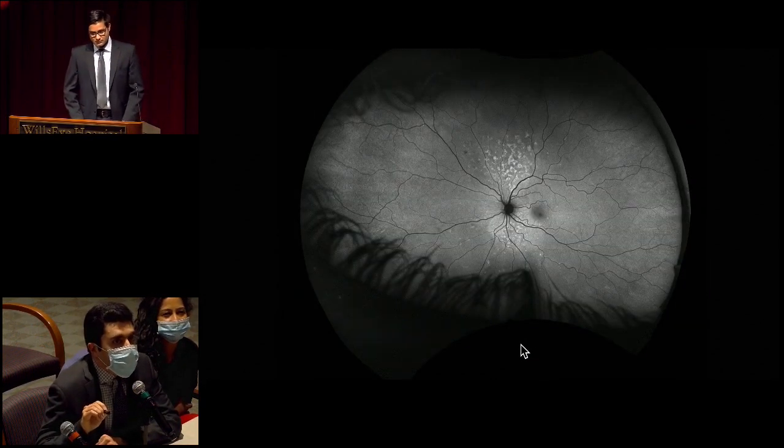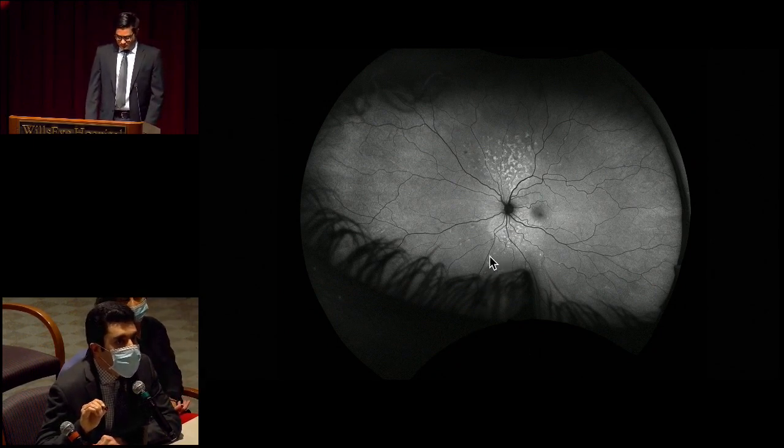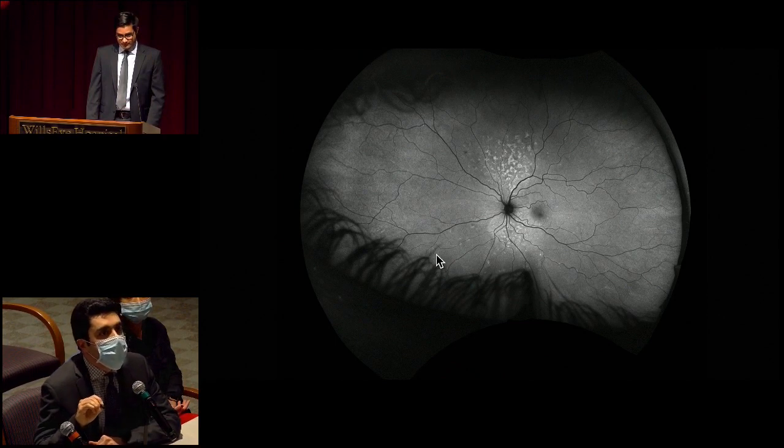Same imaging modality of the left eye, similar changes in autofluorescence patterns here, much less than what we see in the fellow eye, but we have these intervening areas of hyper and hypo autofluorescence in the superior retina, inferior retina, a few spots in the macula itself, and also nasal retina. Once again, the mid-periphery and peripheral retina appear relatively normal. Great, thank you.